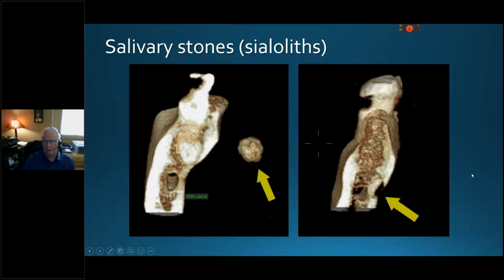The Japanese researchers, early radiology researchers many years ago, did sialography on a lot of these lesions and found branches of the submandibular salivary gland ductal system going into this region. So we now know the origin of these defects. They're not Stafne defects, they're salivary gland depressions.